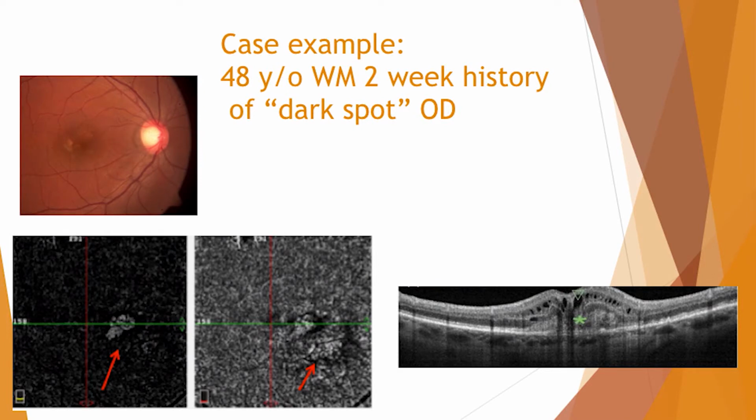We do a B scan, and you can clearly see on the B scan that the hyperreflective area is above the level of the RPE. So again, this is a pretty easy B scan to interpret. I would say it looks classic. What if you want to confirm? What if you want to be sure?